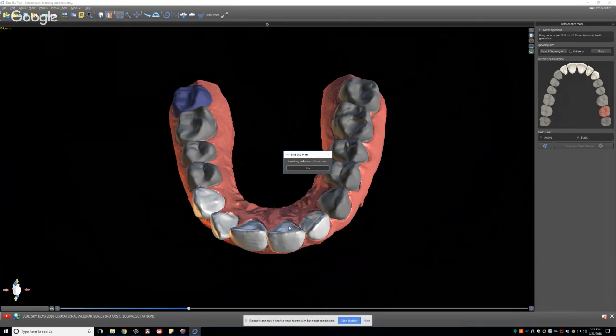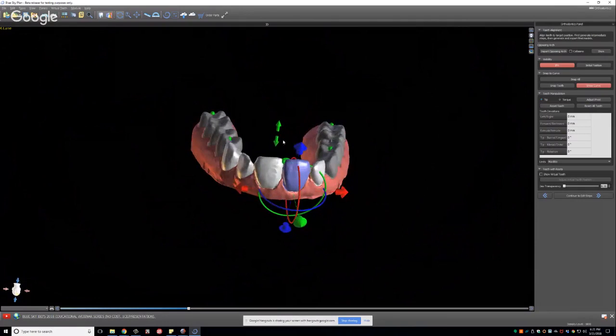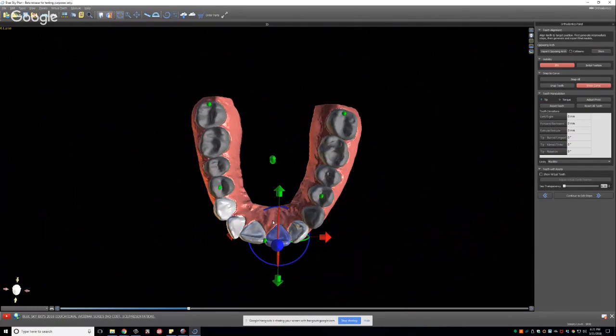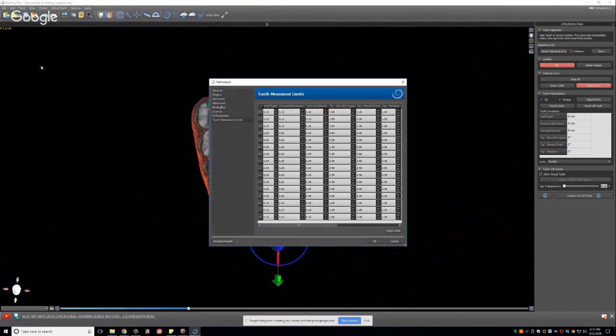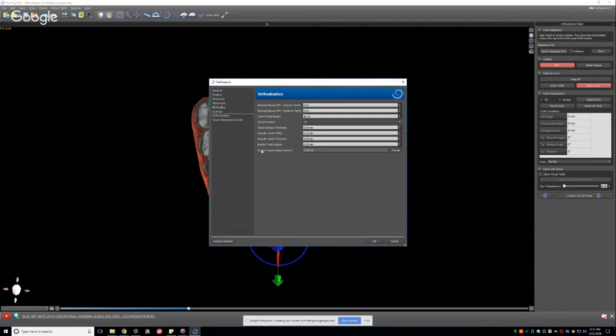The software now inflates the tissue ever so slightly. We found that a very minor inflation, minimum of 0.2 of a millimeter, helps with tissue irritation, but also helps with model printing. It keeps the models from being as irregular along the tooth borders, gingival margins. So what's going to happen on your screen is you're going to have a little screen that pops up.